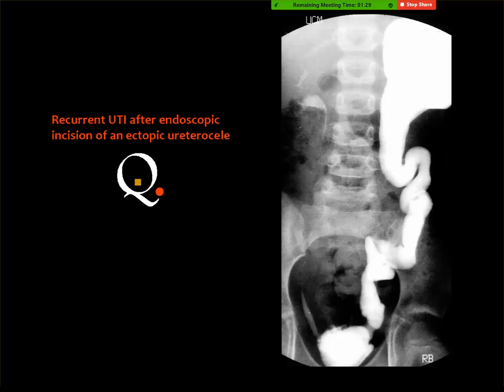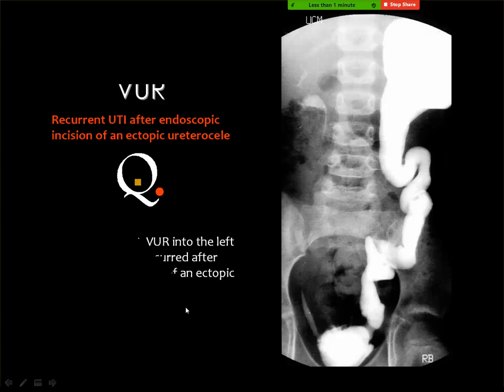Ureteric diaphragm on the proximal distal part of the left ureter. Ureteric what? Diaphragm or stricture on the distal part. Okay, and you see that the renal pelvis is huge, the ureter is tortuous and dilated, and of course this is not a stricture because it is of a good caliber in here, and if it is a stricture it will be thread-like, and in order to result in this huge dilatation of the proximal part of the ureter and pelvicalyceal system.